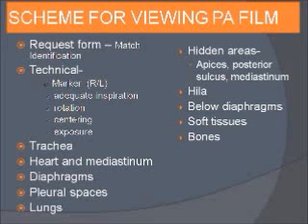And then we should see whether the exposure is optimum or not. The chest X-ray may be underexposed or overexposed. I will explain that by showing images. After evaluating the technical parameters, we should go on to evaluate the different structures.